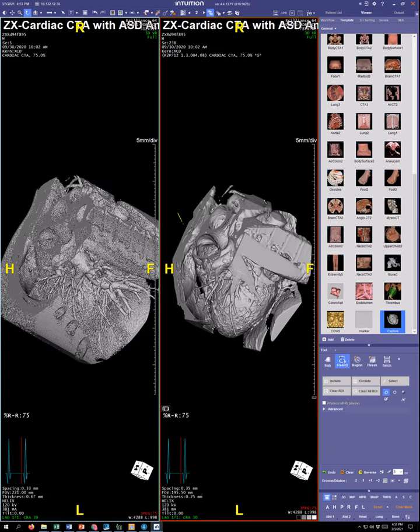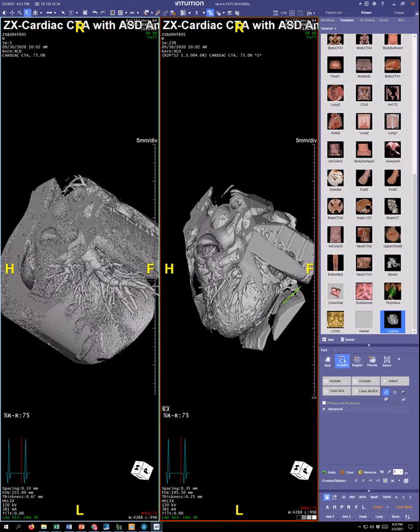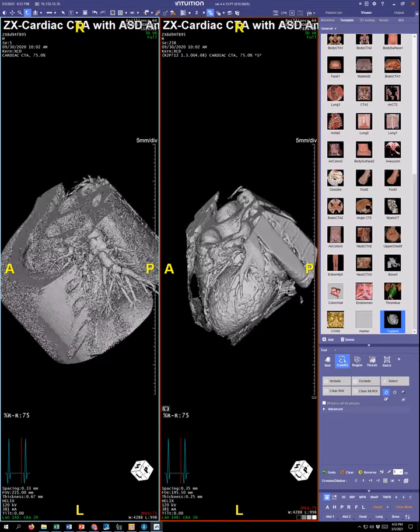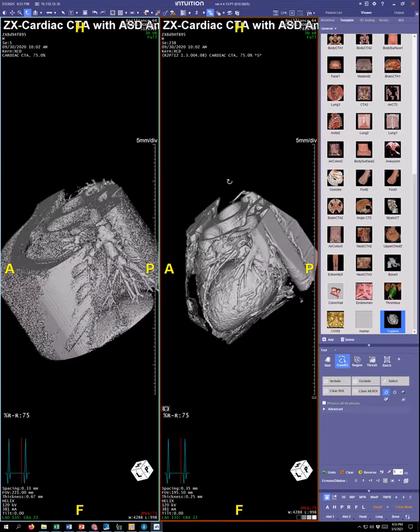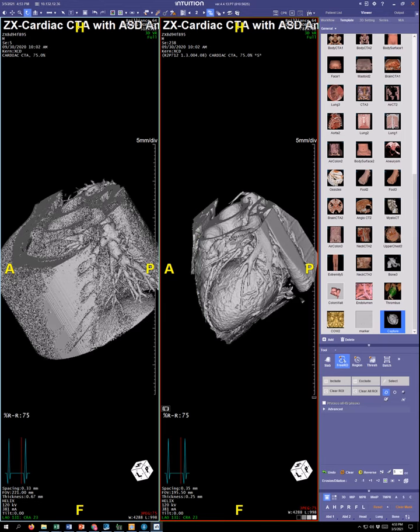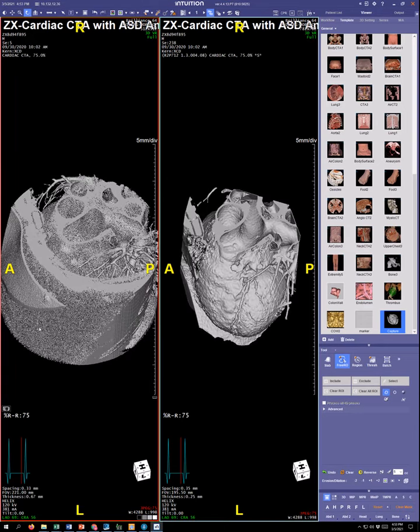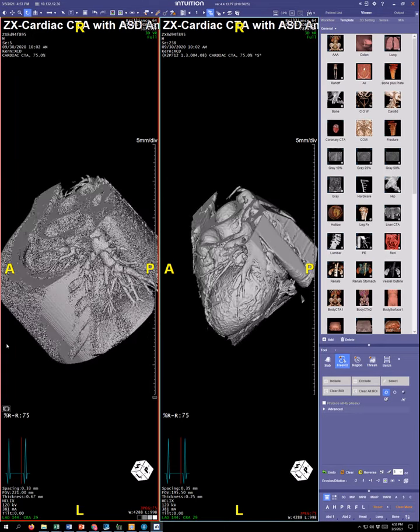This should be synchronized. The anterior chest wall stuff is there. There's some diaphragm stuff there. A little bit more anterior chest wall there. Anyway, you get the picture. Oh, it's not happening in the other data set.